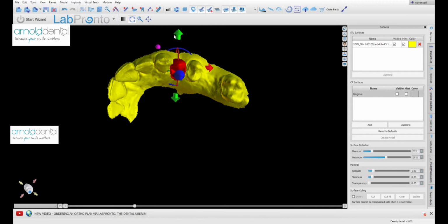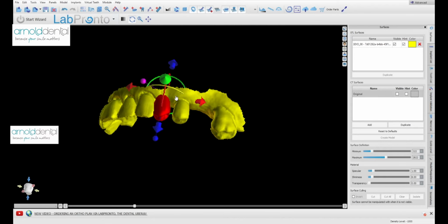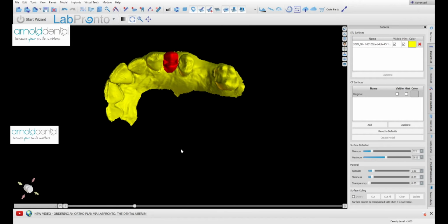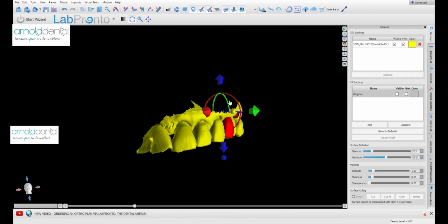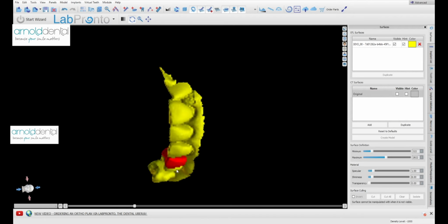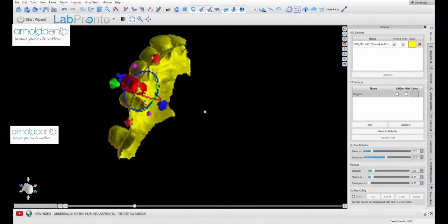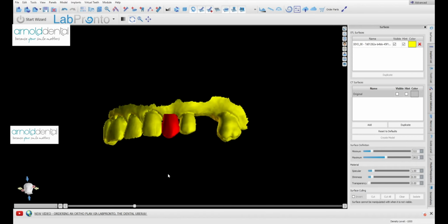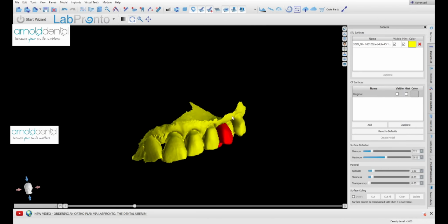We're only doing one implant here in this 4 space, so what I've done is I've imported a tooth, and I'm now manipulating it so that we create an idea of what we want the finished result to look like. This doesn't have to be perfect, but the closer we get this to a final result, it makes the implant placement that little bit easier, and it makes the lab's job easier as well, so they're not having to correct angles or misplacements of implants.